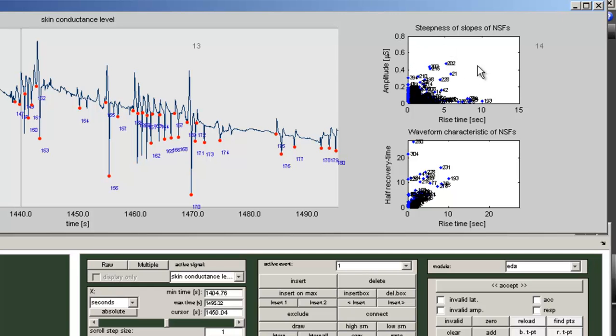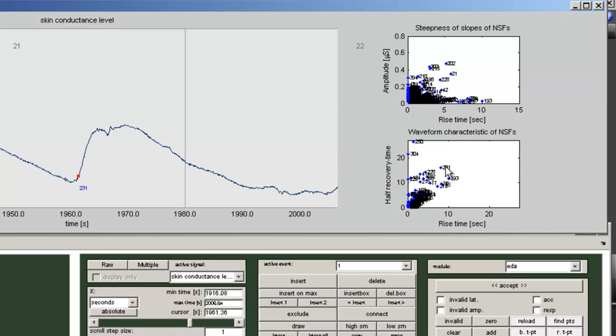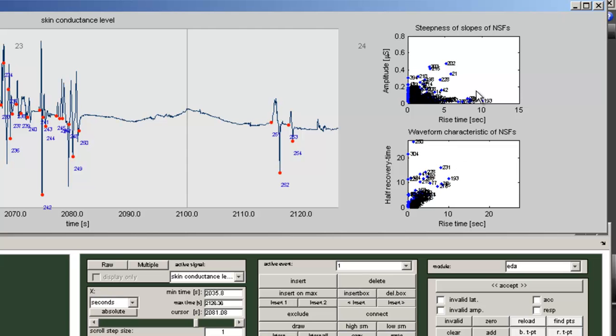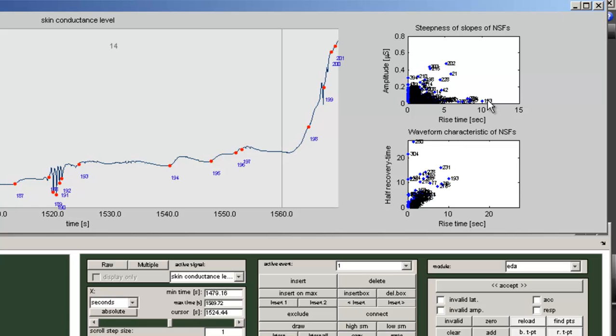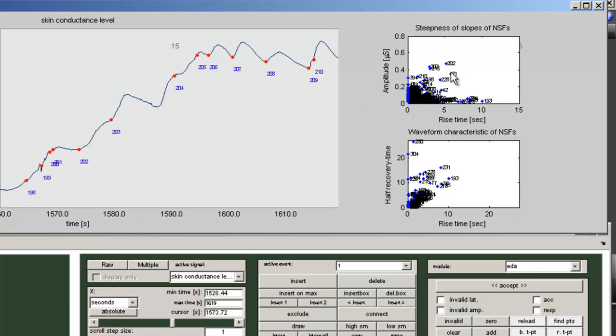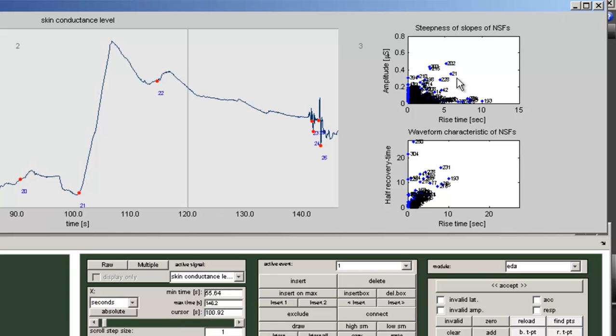Similarly, this plot plots those fluctuations by amplitude and rise time. So what this plot does, it shows fluctuations that are atypical in this distribution, and you can click on those and jump to those fluctuations. So here, since there are so many artifacts, the outliers are actually the correct fluctuations. So these plots are not of much help. We rather have to start editing here.